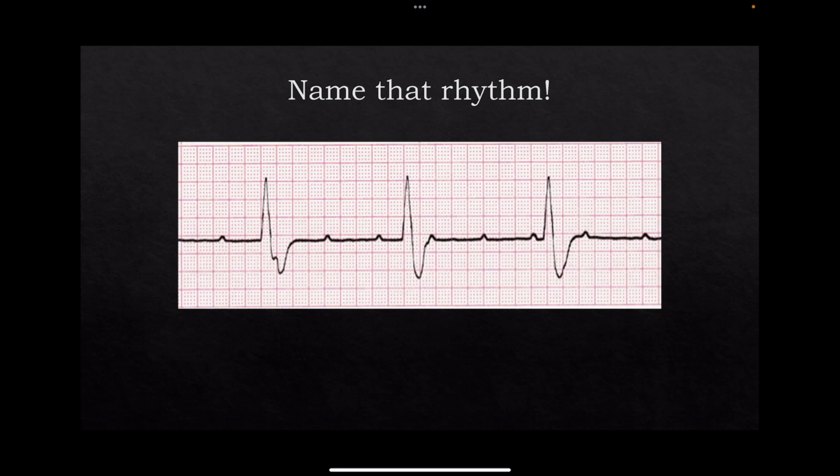Okay. This is third degree heart block. Why is this third degree? Do the P's and the QRS's talk anymore? Now, if you took calipers and you measured out those P waves and you marched them out, the P waves would be equal throughout. That's one good sign right there. P waves are constant. Everyone see those red lines I just drew? If you measured all those out, they would be even, which means the SA node is firing normally.